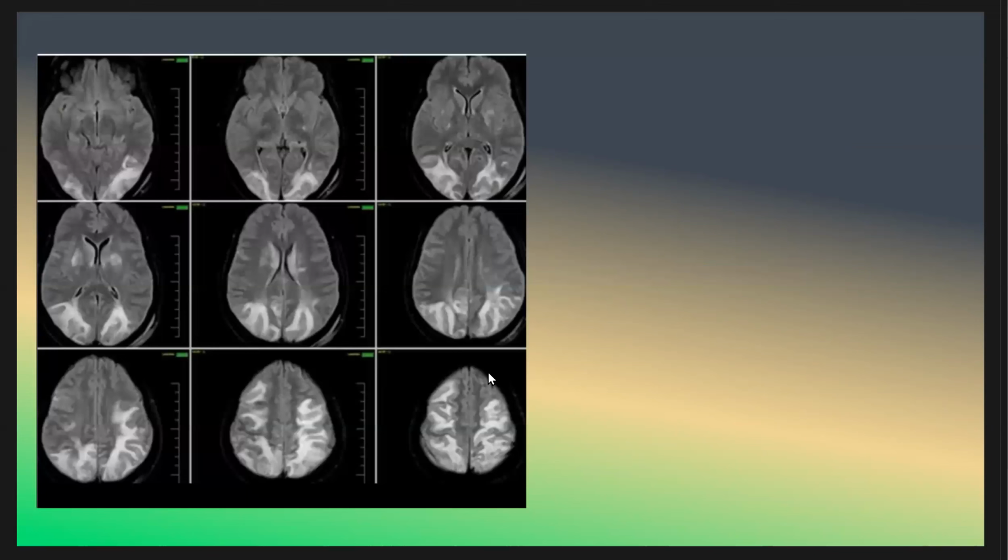And this is a classic of PRES. This is a classic of PRES. We move to the next case.